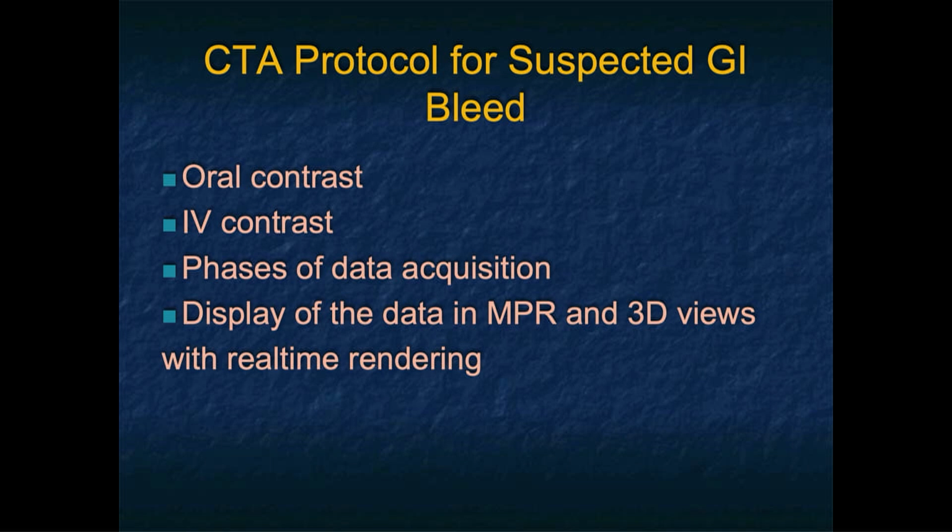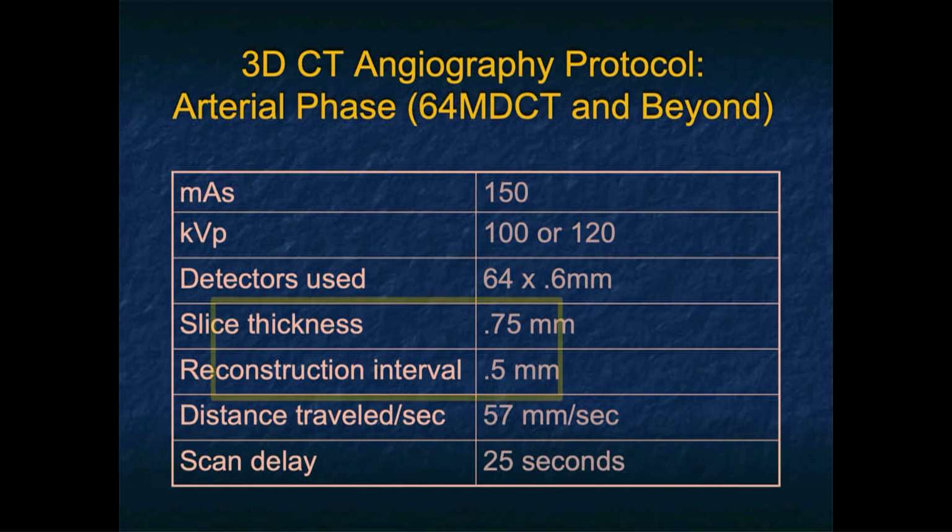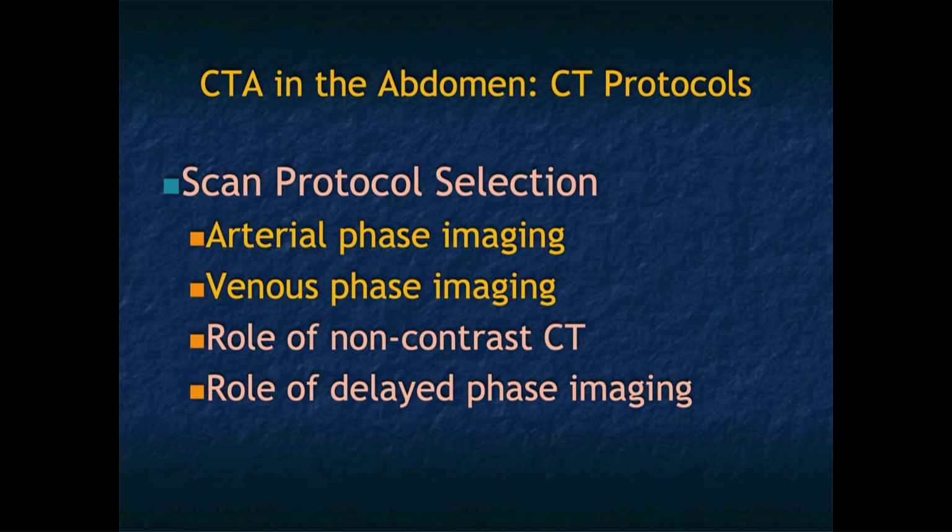And I think it's also very important when you analyze the images, you look far beyond the axial images. Multiplanar is very important, and 3D, particularly MIP imaging, proves to be very valuable. We'll use thin section CT, typically 0.75 every 0.5, and again, sticking with dual phase acquisition. For all of our cases of suspected GI bleeding, we'll always scan from a little above the diaphragm till the lower portion of the symphysis. So even if we suspect it's an upper GI bleed, we're still scanning.